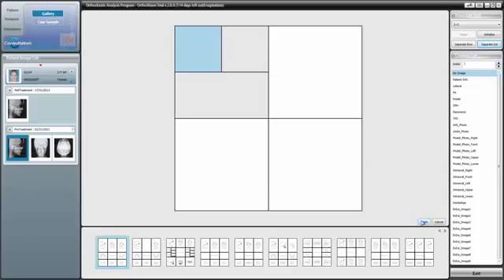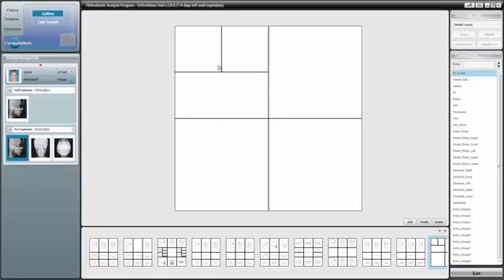As you can see, when we do this, our new design shows up in the thumbnail gallery at the bottom of your screen and is displayed prominently at the top. This concludes our basic introduction to the gallery feature of OrthoVision.